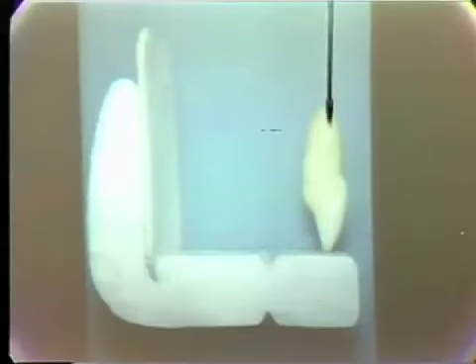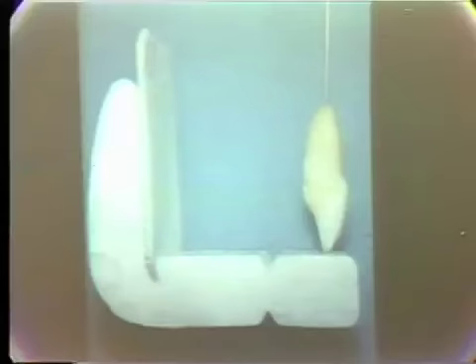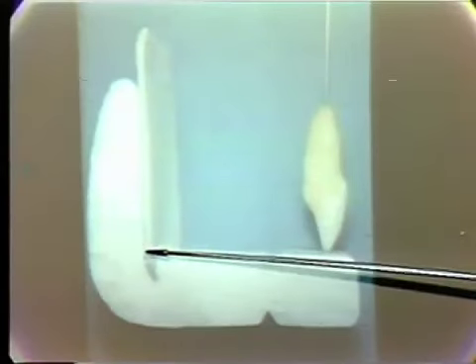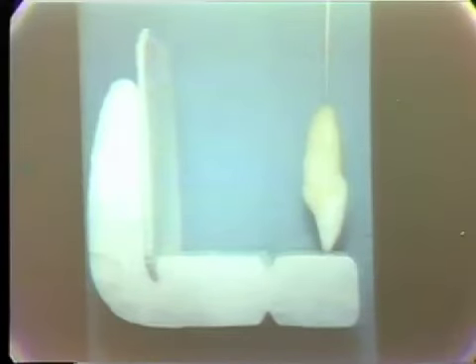Here we have the long axis of the tooth simulated with a piece of orthodontic wire, and we see the long axis of the tooth is positioned parallel to the plane of the film. We wish to direct the rays at right angles to both the long axis of the tooth and the plane of the film. Here is a right angle indicated for us by the top of this bite block. So this is going to be our clue for the direction of the rays. Then we turn to the next slide here.